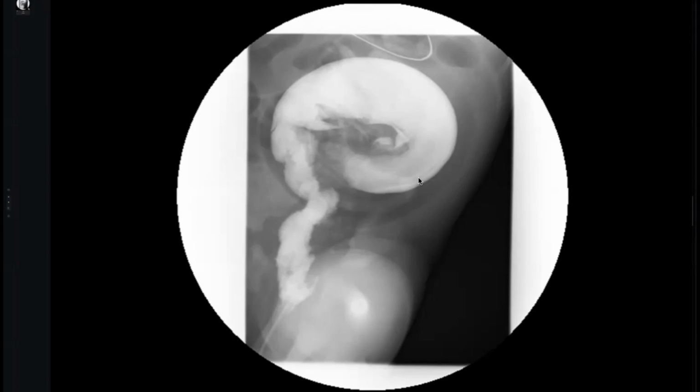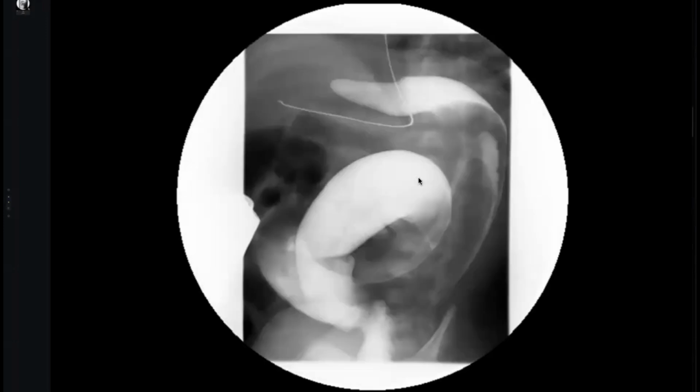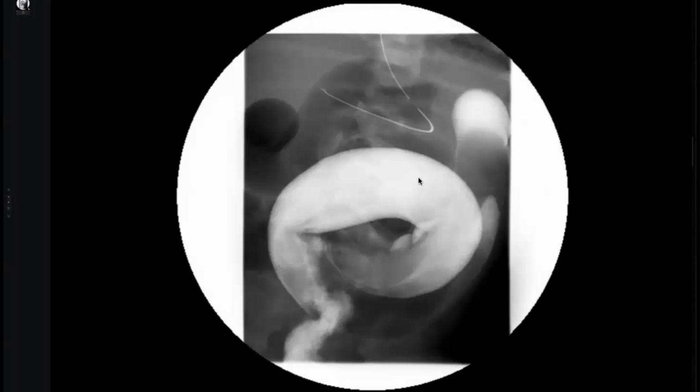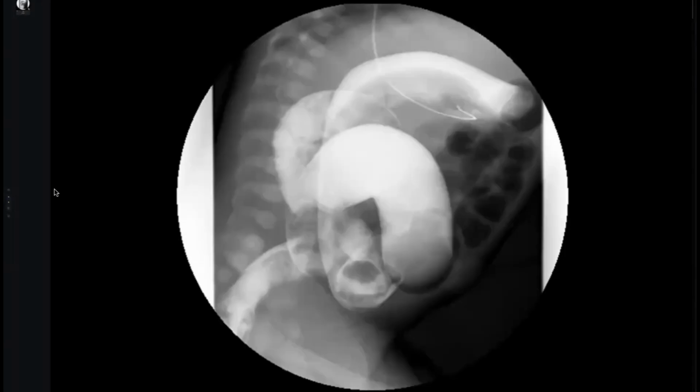In 4. But when we are describing, doctor, this is a barium study like this. The catheter is from down. The contrast is going up. Okay, this is too much verbosity. Too much verbosity, my colleague. Okay. Thank you, doctor, so much. Thank you. You did very, very well.